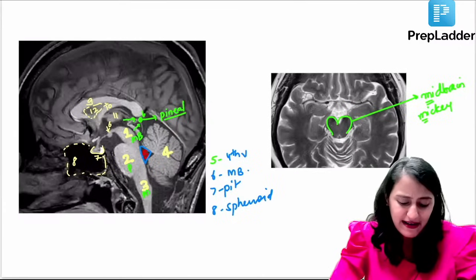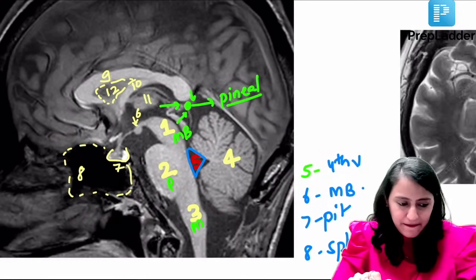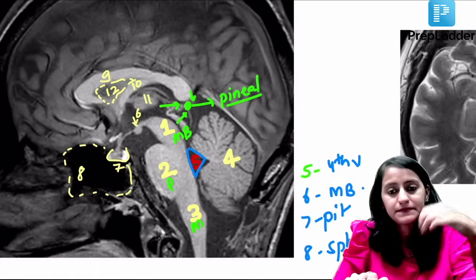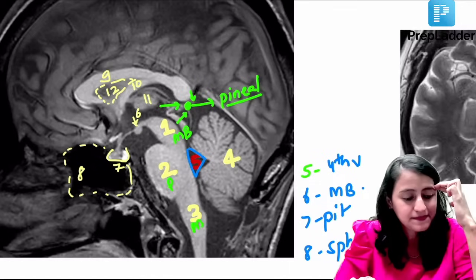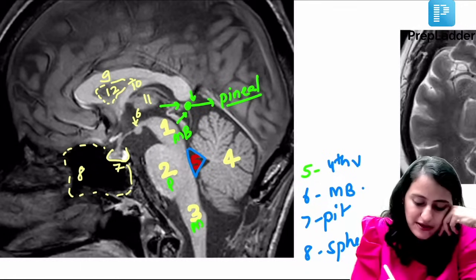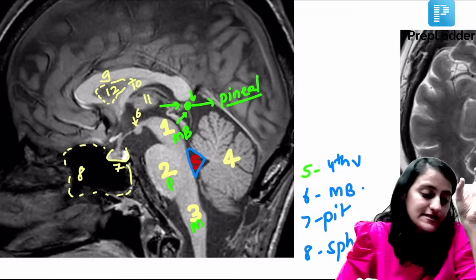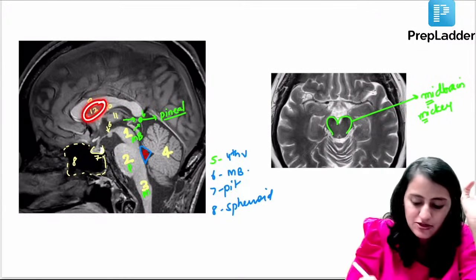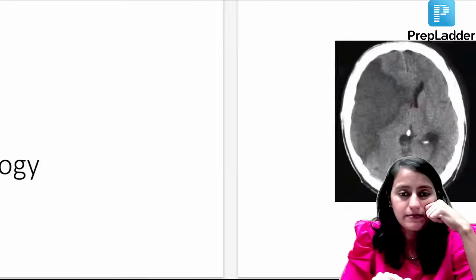Now, this MRI, you tell me, is it a T2 weighted MRI or a T1 weighted MRI? Think logically and tell me, is it T2 or is it T1 weighted MRI? Very good. You can see the corpus callosum, the white matter is white. So it's a T1 weighted MRI. The ventricle is not white. The sulcal spaces, CSF are not white. Correct, it's a T1 weighted MRI.